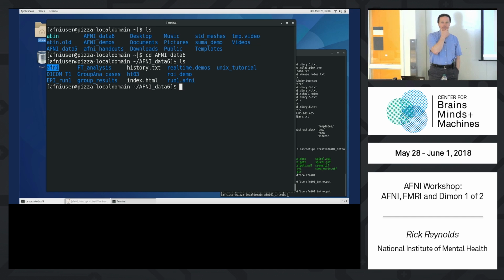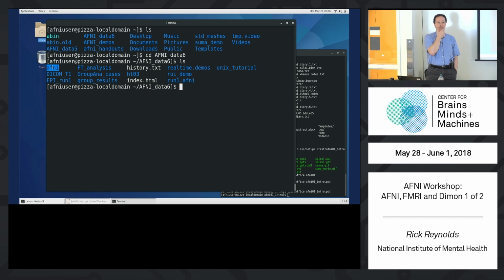We use the word AFNI way too much. So AFNI can mean many things. Capital AFNI is the name of our software package. Little afni is the name of the graphical user interface you can use to look at volumetric data. But little AFNI in the directory structure is where we often put some of the AFNI data.